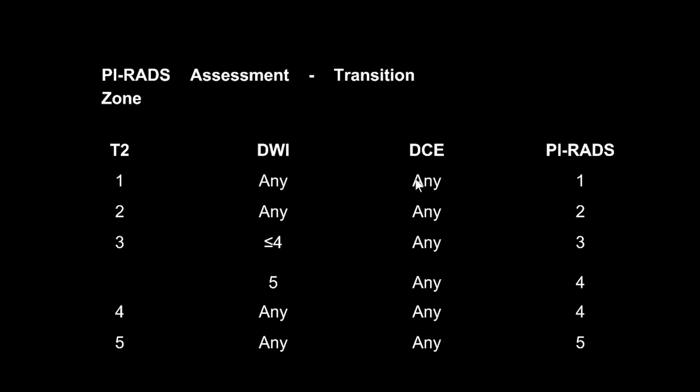If you start to see a bright nodule that's bigger and irregular and it enhances or has some nodular enhancement, you may have to worry about the rare mucinous tumor. However, that's really exceptional. So well-defined nodules in the TZ, or central region of the prostate, with any diffusion character, with any DCE MRI, with the exception that I just mentioned. You know, early enhancement associated with a bright nodule, got to worry a little bit, but typically bright nodules and gray nodules, encapsulation is key.